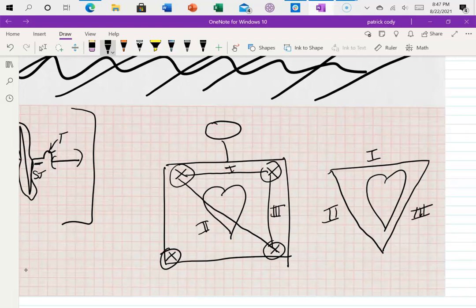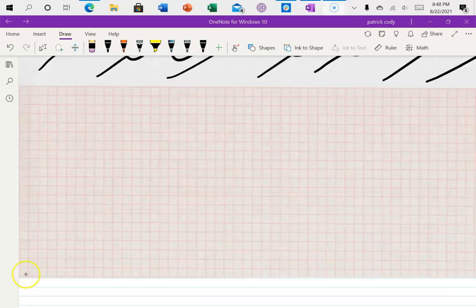So typically when we are looking at rhythm strips, we're going to look at lead 2 because it's going to have the most direct view over the right atria where our SA node is. Okay, so we're going to be most of the time looking at a lead 2 rhythm strip as we start our single lead interpretation. So what I want to spend the rest of this lesson doing is talking about the most basic atrial rhythm, which is called normal sinus rhythm, and we're going to talk about clues to identifying its presence versus the presence of other things.